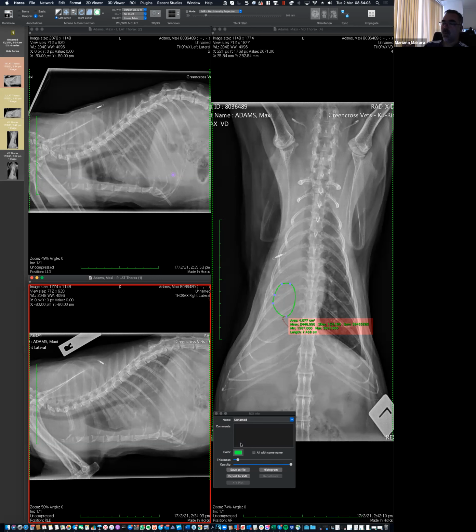And probably one thing to mention is that this is the ideal case because the problem that we have with ultrasound is that we cannot go through gas. But in this case, that whole right hemithorax is either mass or fluid. So it's the perfect scenario just to put a probe. And if you put a probe, you can ask: is it all pleural effusion?